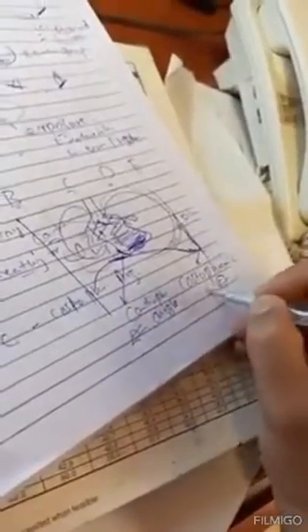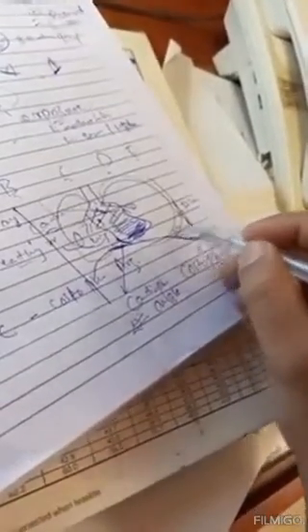These angles are important to show pleural effusion. If these angles are not clear and they are blurred, it means that there is some sort of fluid coming out of the lungs, right? So in pleural effusion these angles will be blunt, right? Look at this x-ray. We have read A, airway: look for the airway, trachea, bronchi, etc.; breathing organs, lungs, etc., and pleura; and C for the costophrenic angles, right?